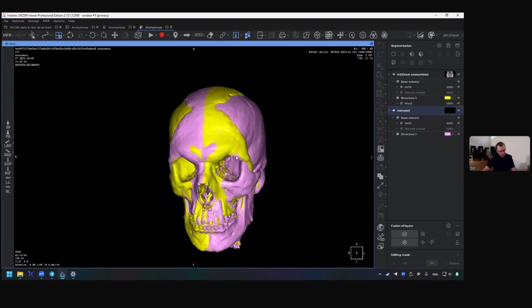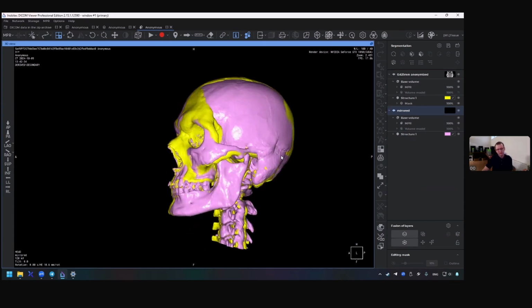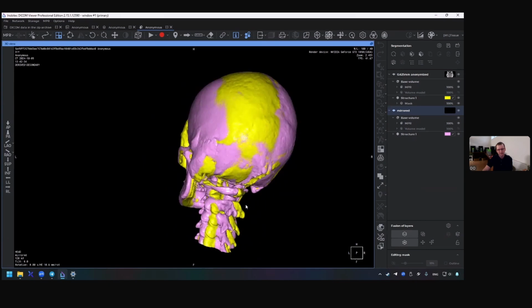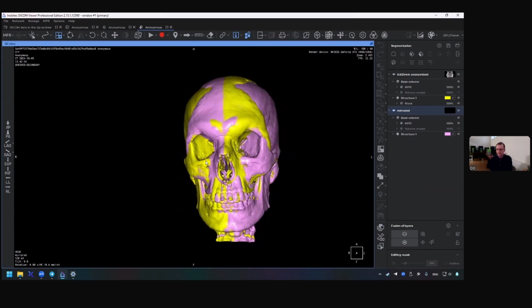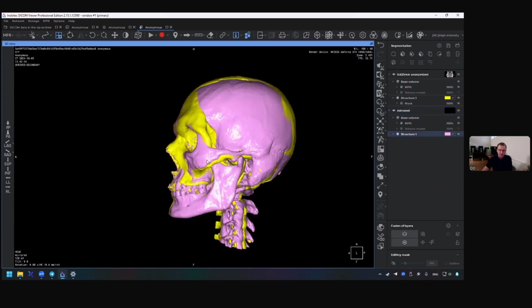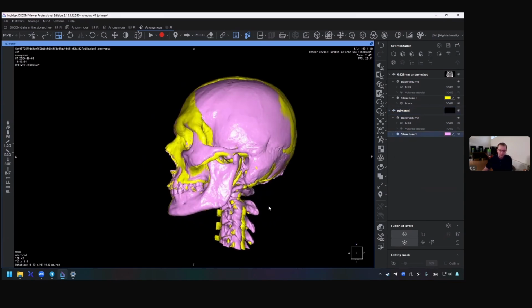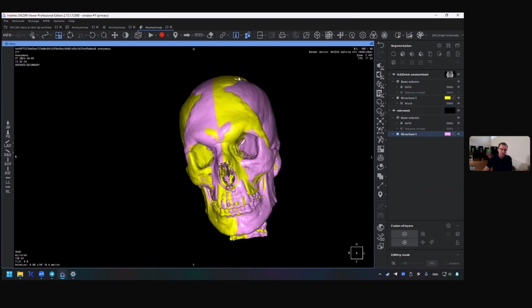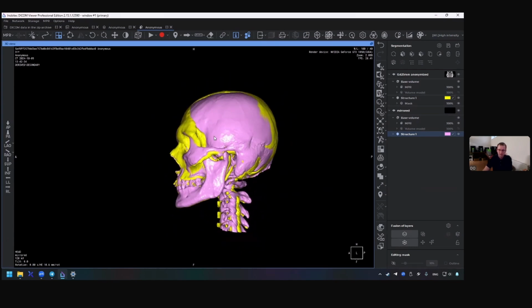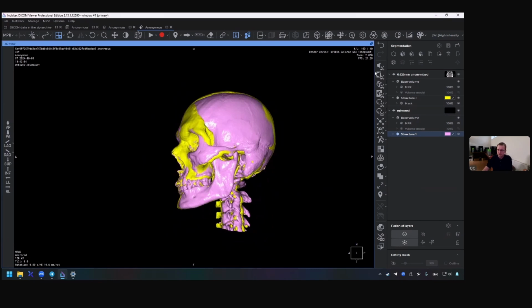Okay, but not perfect, because in this situation we have rotated vertebrae, and for some cases it is needed to make an alignment not using the whole series, but only the segmented structure after excluding from the structure some asymmetric elements, for example, vertebrae, like in this case, or drainage, or shunts, or some bone fragments, maybe.